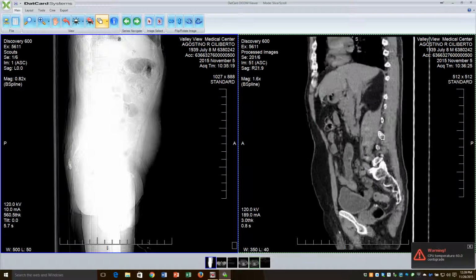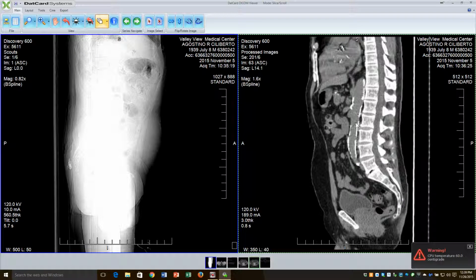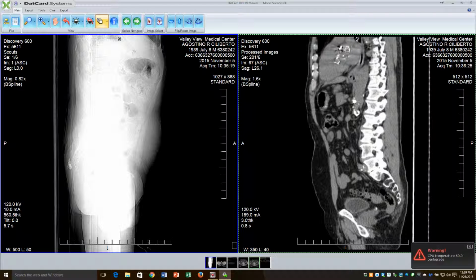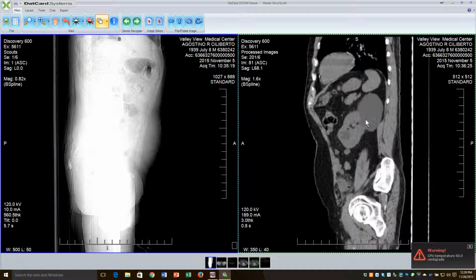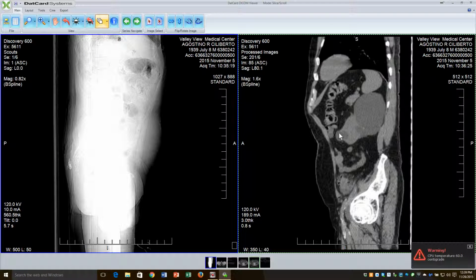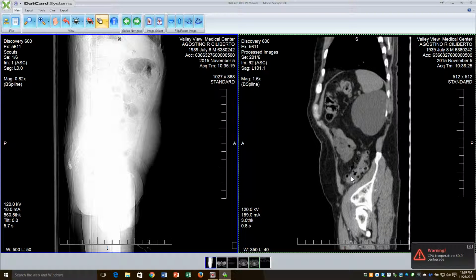So here again is aorta, lots of atherosclerotic hardening of the arteries, atherosclerotic disease, lots of disease in the heart, lots of disease in the coronary vessels. Giant cyst on that left kidney, and you can see how big it is. Even has a smaller cyst here at the apex of the left kidney. Here's the sigmoid diverticular disease right here.